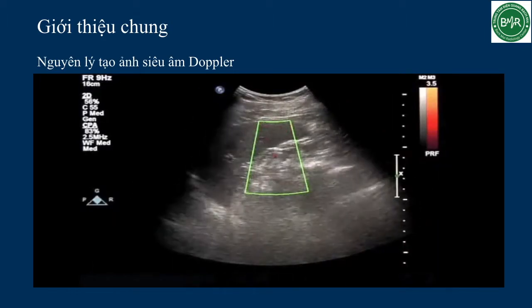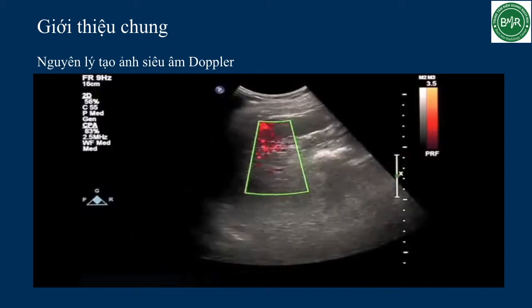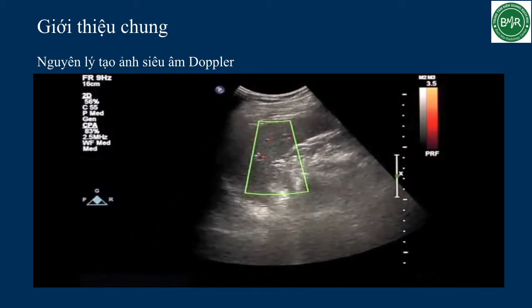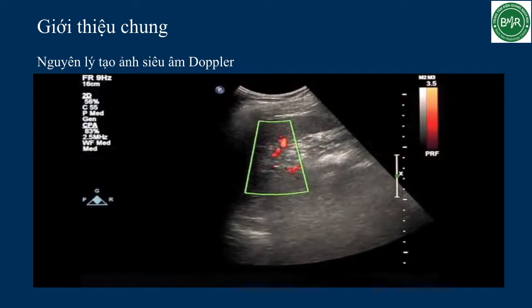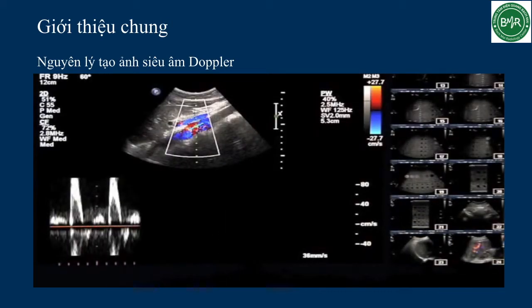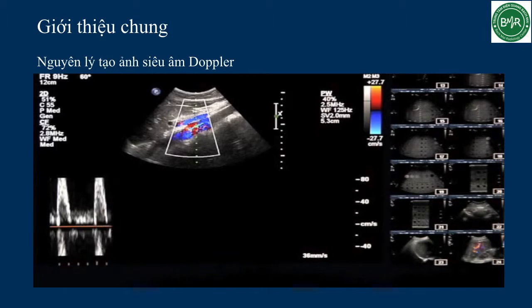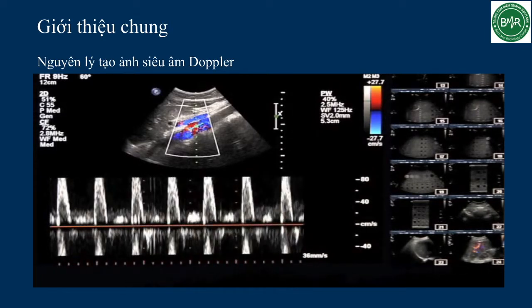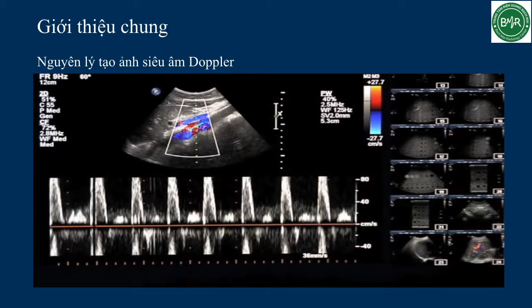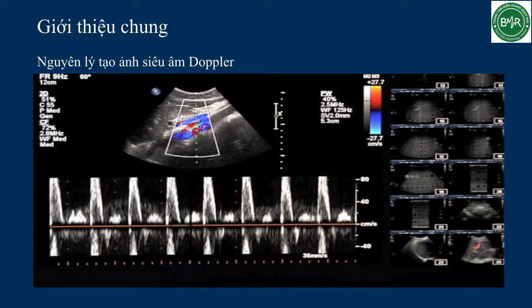Power Doppler is more sensitive than conventional color Doppler for the study of small vessels which have low blood speeds, as it overlays Doppler information on a grayscale image and just shows the energy within vessels. It can also be used when unsatisfactory color Doppler images are obtained, as it is less reliant on the correct angle of incidence of the transducer.